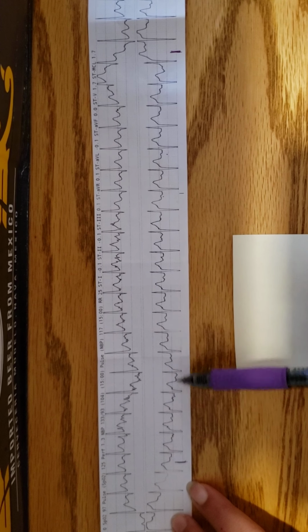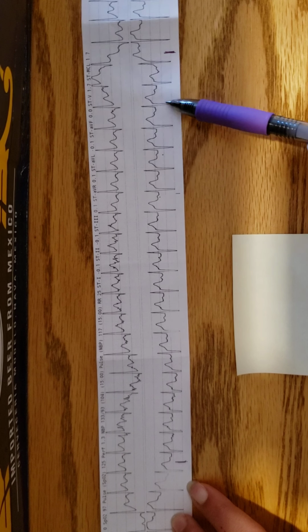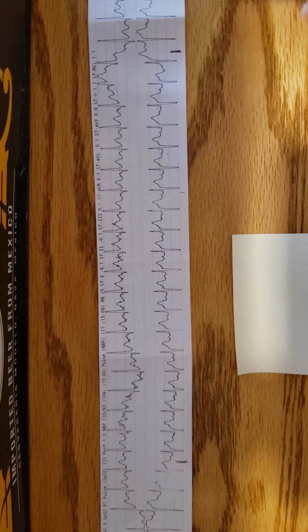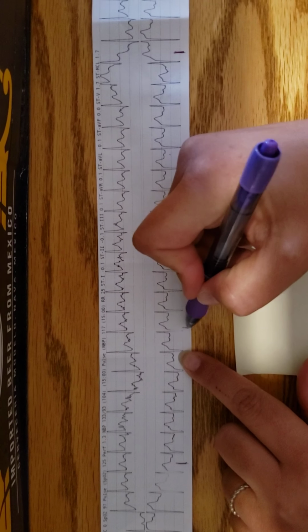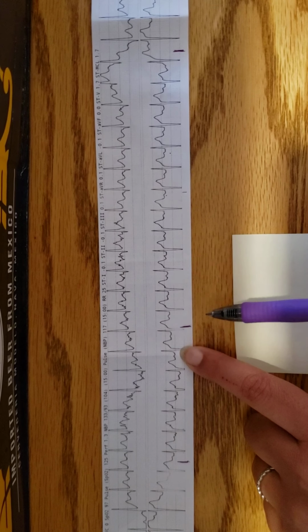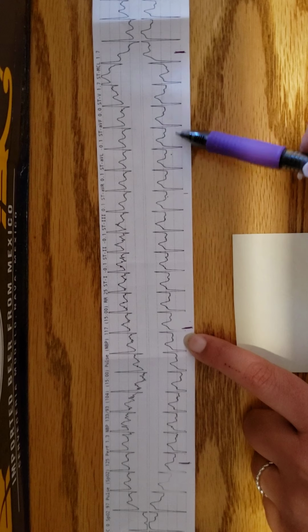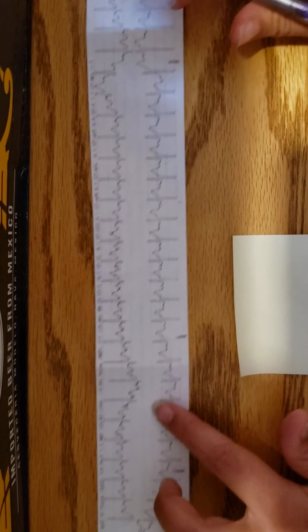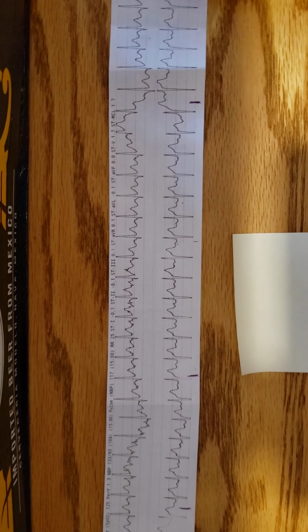So 1, 2, 3, 4, 5, 6, 7, 8, 9, 10, 11, 12, 13, 14, 15, 16, 17, 18, 19. Yeah, so you're talking somebody whose heart rate could be in that section there, you know, like, oh, I'm sorry. Makes it better, doesn't it? I missed a 6-second marker. I apologize, guys. 1, 2, 3, 4, 5, 6, 7, 8, 9, 10, 11, 12, 13. Like 13. So 135. That makes it a little better, right? 135 there, but it's normal. So that's just sinus tach.